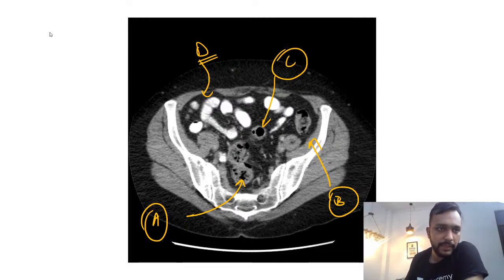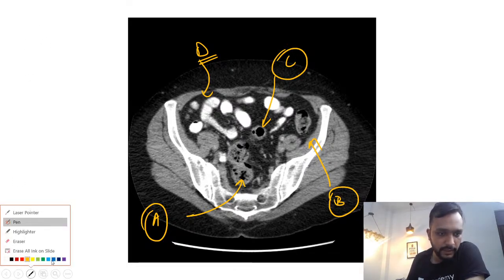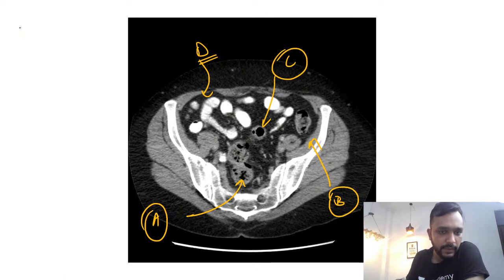Okay, so let me help you. The structure labeled as A in this image is your rectum, right?